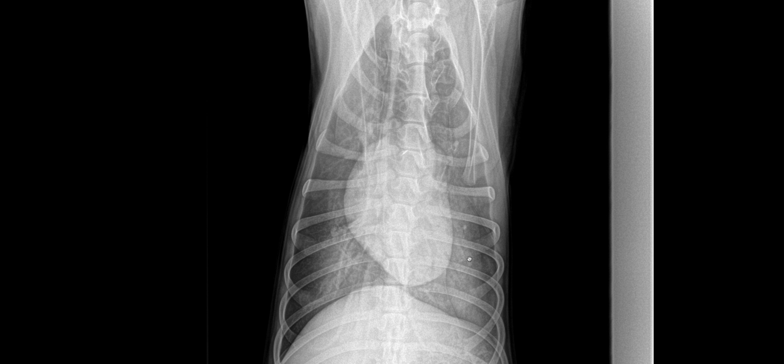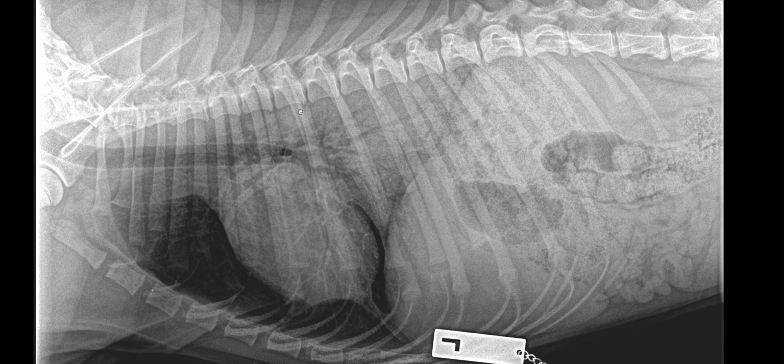So as you can see, the lung lobes show a diffuse increased soft tissue opacity, but on that ventrodorsal projection, we can still delineate the cardiac silhouette and the diaphragm outline. On the lateral projections, this is also visible, but now the increased opacity is so pronounced that we are losing the delineation of the diaphragm and slightly of the cardiac silhouette, and we better see the air bronchograms, which are the bronchi filled with air. This means that the alveoli around those main bronchi are filled with fluid or collapsed, for example.